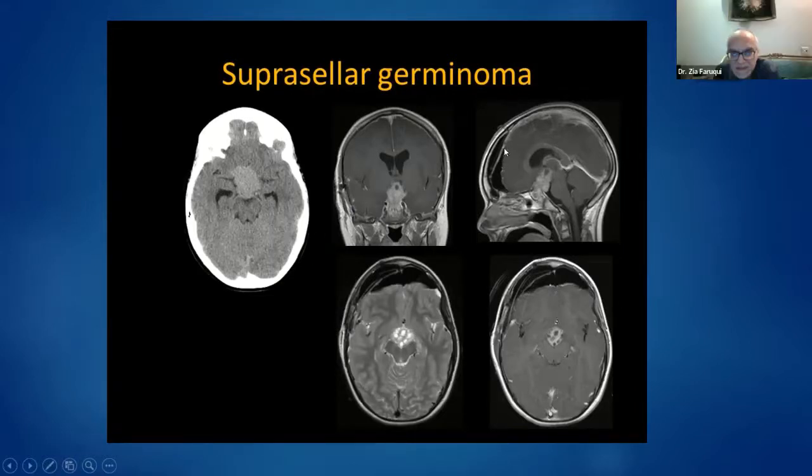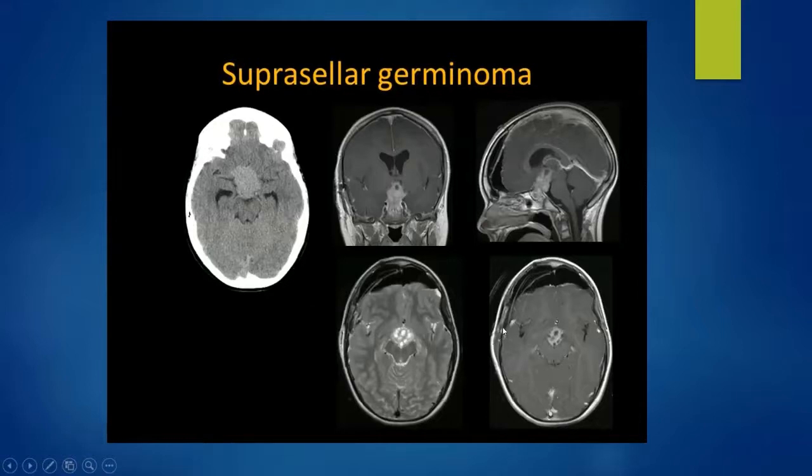One is that it has had surgery, okay. So the pneumocranium is well spotted, somebody has gone and taken tissue from it. The other thing which you need to look for is there is meningeal disease. You can see that the meninges are thicker, and yes, I can see enhancement, and you can see little nodules over there as well, okay? So this tumor has spread to the meninges as well. You can see these little nodules here and a little nodule here and some nodule back there, okay?